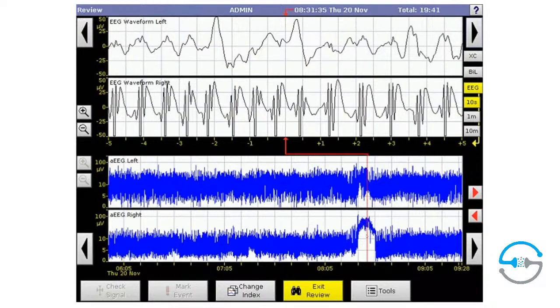Combined with the fact that over 10 microvolts, remember we move into the logarithmic part of this scale. And now instead of there being only 10 microvolts between here and here, now once we're above this line, between here and here, the equidistance between these two lines, we have 90 microvolts. So the seizure voltage is high, but it's also in a very narrow bandwidth in the sense of there's not a lot of variability, which is what causes the shrinking of that.